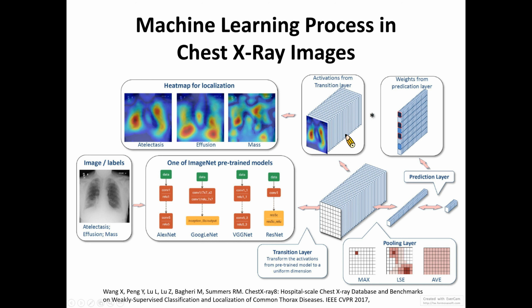Although there was no demographic information, you can see different sizes of the lung and chest cavity in different files. You will also see different imaging conditions like PA views, posterior to anterior, or AP views, anterior to posterior, for supine, standing, etc. So it is indeed very challenging, but it's very fun. And all images were stored in DICOM image format.